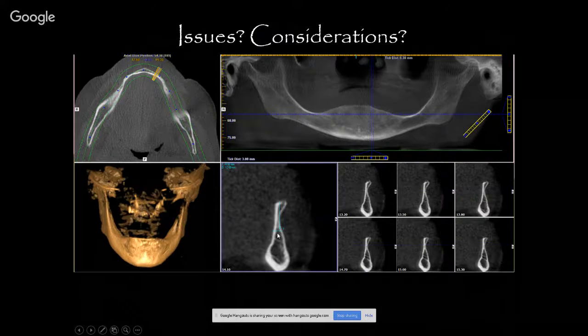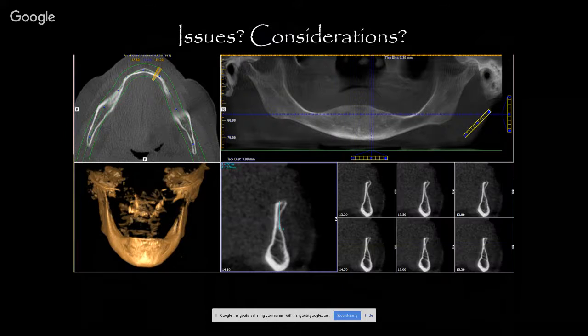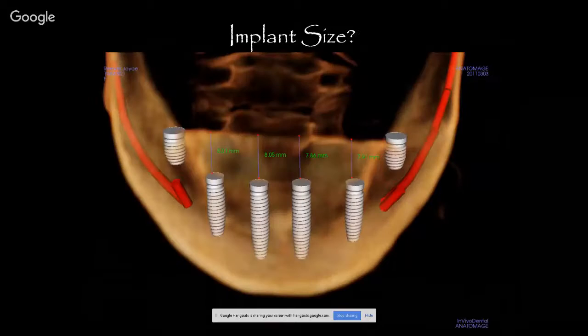And so looking at both of these images, at the initial surgical visit, do we graft this area or do we remove this area? That is usually what I'm thinking. So what I did was I treated and planned my implant sites and sizes, as our patient wants fixed. So approximately 8 millimeters of bone from the tip of the crest down to the head of the implant is where I can get my implant to sit in, but not having 1.5 millimeters of bone surrounding the tip of my implant. So again, I'm going to have to place that another 4 millimeters down.